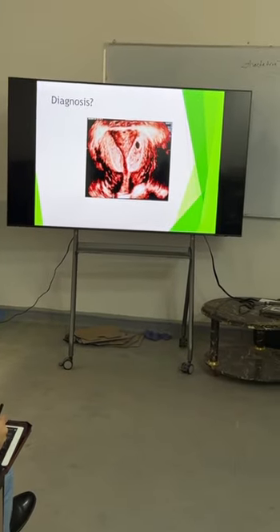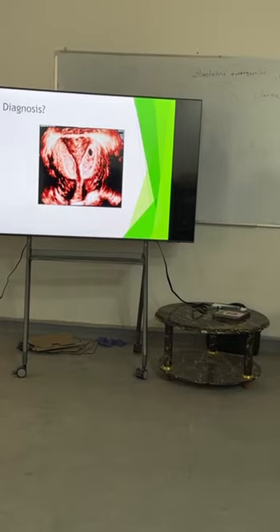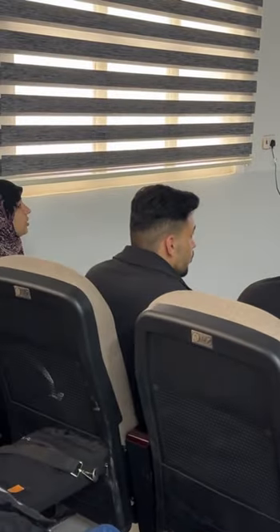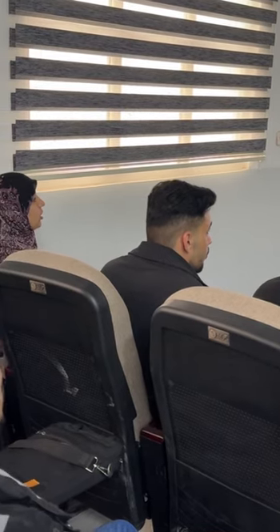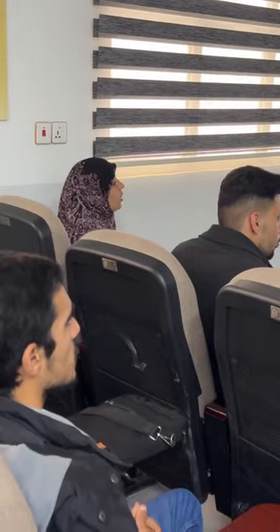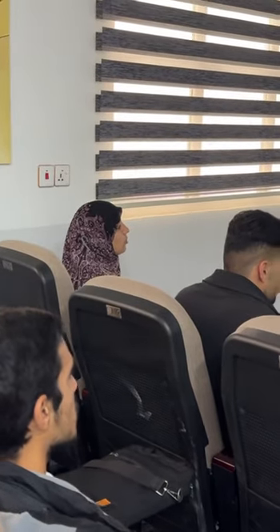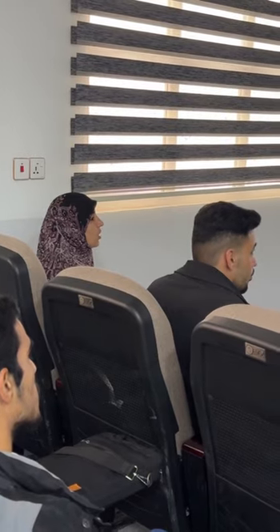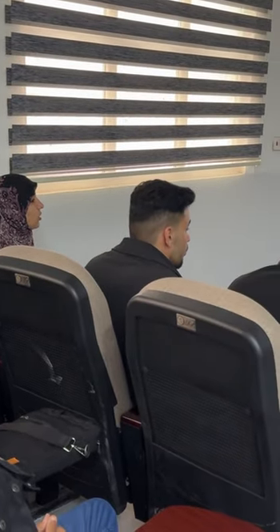Can anyone explain this for me also? What is the type of investigation? Transvaginal ultrasound. Show us the septate uterus. Describe first to reach the diagnosis.